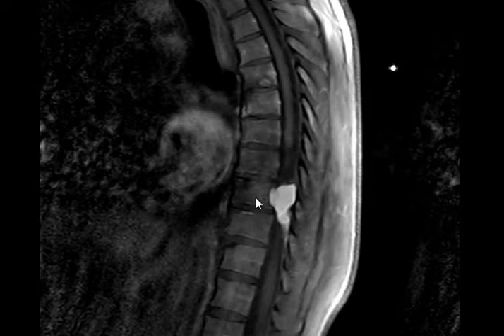Of course, definitely it is part of the differential diagnosis. If you see this or a similar lesion in the periphery, for example in the thigh, say you see a lesion in the soft tissue from the nerve with the same criteria, this will most likely be schwannoma, neurofibroma, nerve sheath tumor.